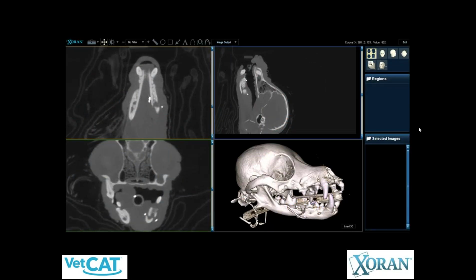And this is the sort of screen you'll see as soon as you're done scanning the patient, about a minute after scanning has started. You'll be able to see a classic MPR view. We'll go over a bit more details in a little bit, but they are basically the various cuts of a CT scan in different directions, as well as a 3D.